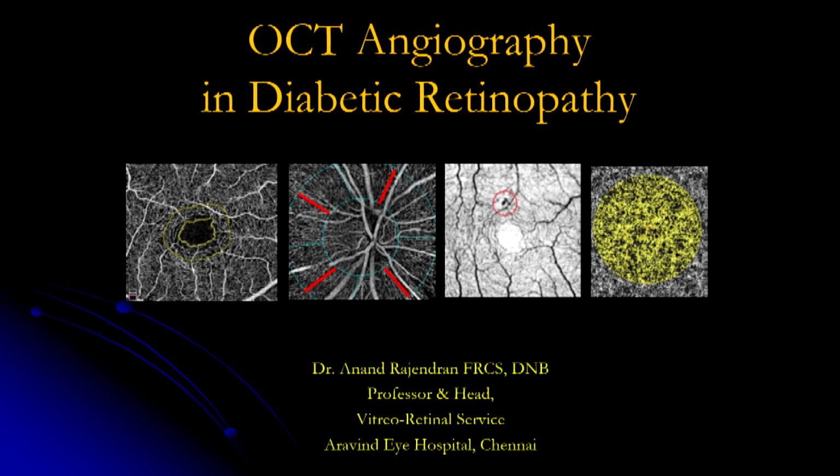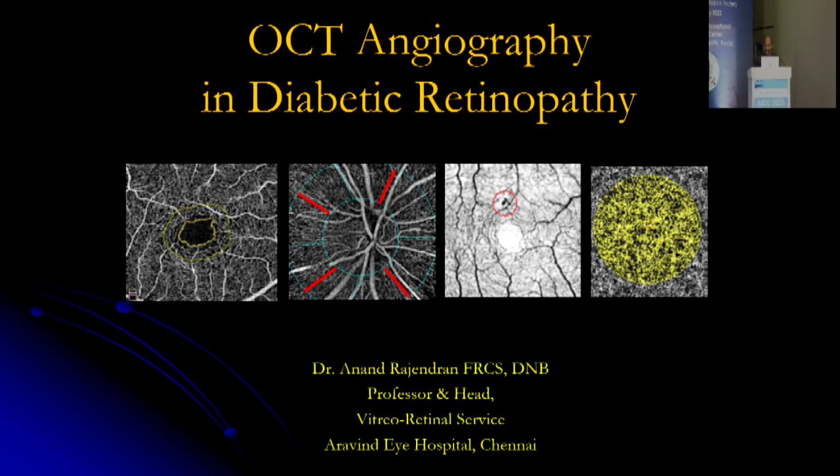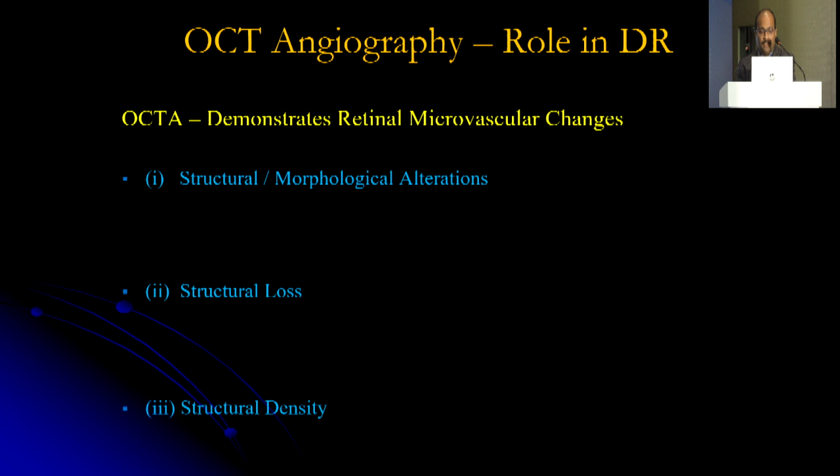So it's my pleasure to talk to you about OCT angiography in diabetic retinopathy. I'd like to thank Dr. Avnindra for having me here. So OCT angiography's role in diabetic retinopathy is basically to demonstrate the retinal microvascular changes.